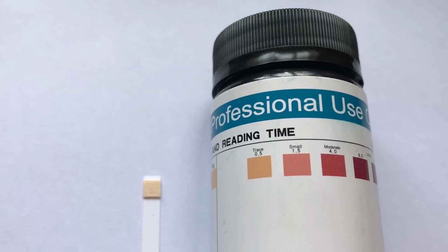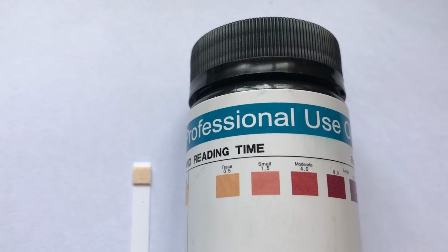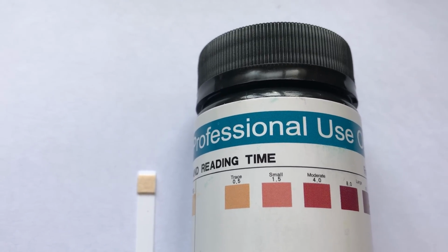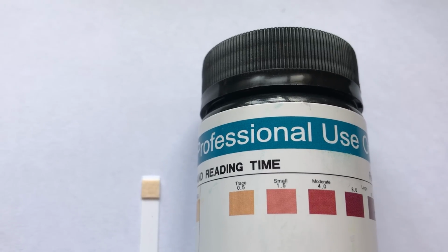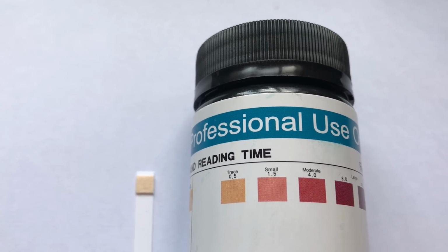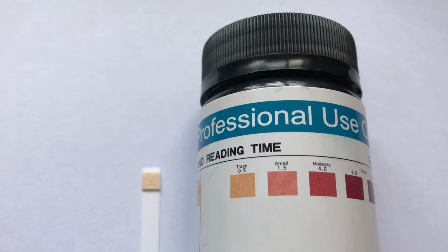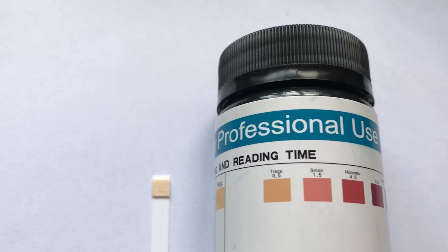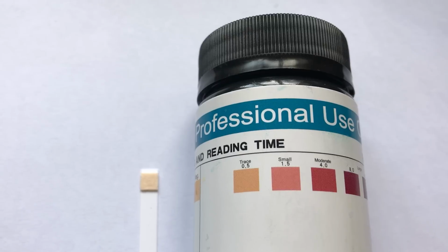It just indicates that your liver enzymes have increased and are converting the urinary ketone bodies back into the energy ketone bodies, so less are coming out in the urine, because the body is becoming more efficient at converting the ketone bodies into the energy source required. So that's how you interpret the results.